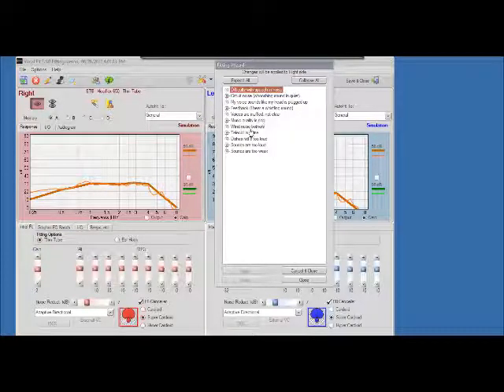Now, these options may not be worded exactly the way your patient is telling you. Like, I had a patient one time complaining of the dog's nails rattling on the hardwood floor. Well, I read through the different options we have here, and for me, dishes rattle too loud kind of was the option that I wanted to pick for that instance.